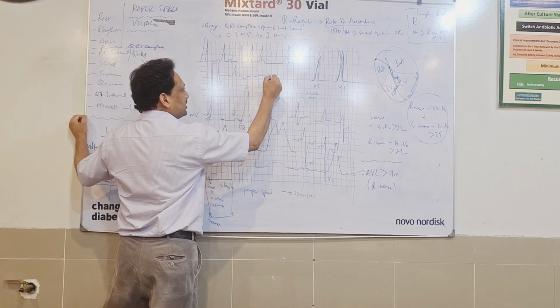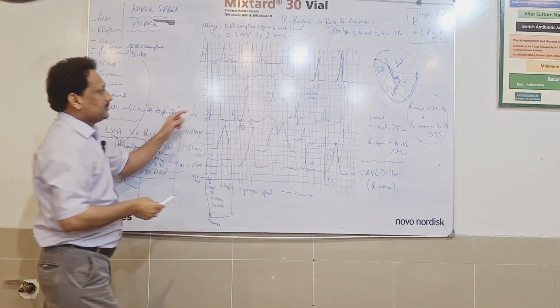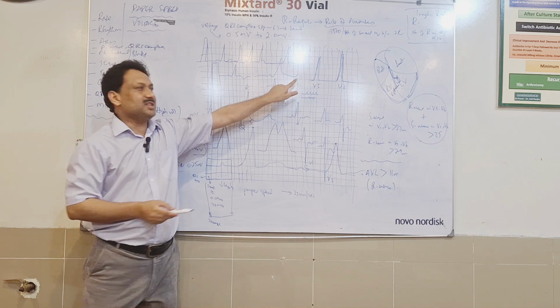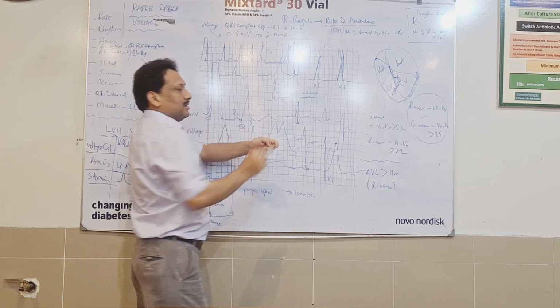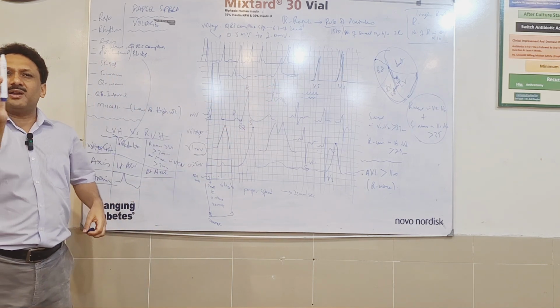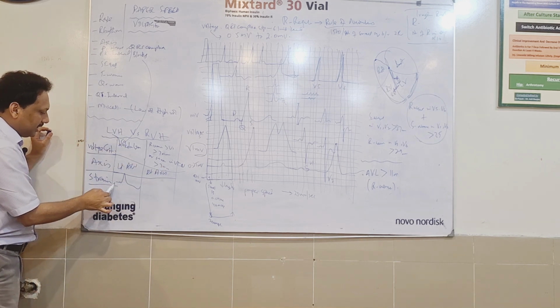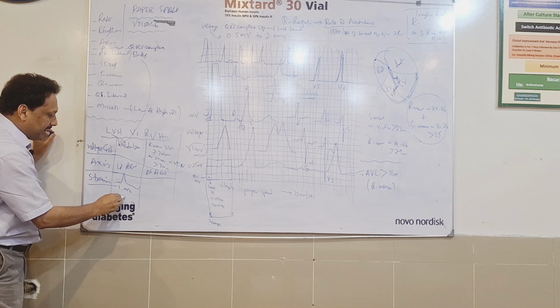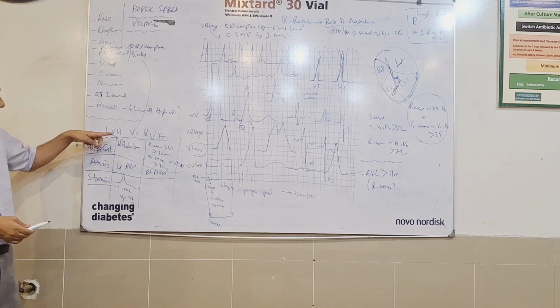In another situation you see T wave like that. So see the difference. This is a symmetrical T wave. This is asymmetrical. If I draw a line here, you see there is no symmetry. This is asymmetrical T wave. So if you see asymmetrical T wave inversion, inverted asymmetrical T wave in lateral leads 1, AVL, V5, V6, we call it strain pattern. So that is the third criteria.